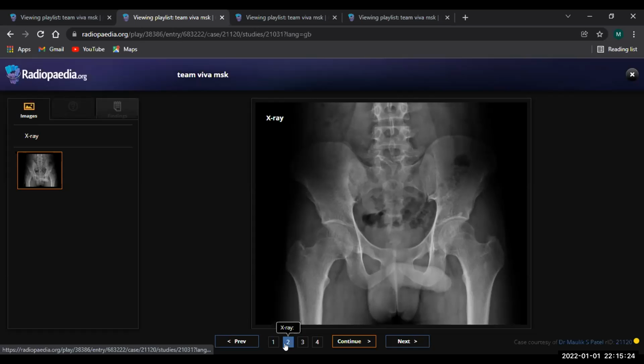Looking at the iliac bone, I'm not seeing any lesions. And the iliac bones, hip joints are normal. The rest of the visualized lumbar spine appears normal. Patient has right-sided pain. Yeah, there is slight sclerosis in the right SI joint.